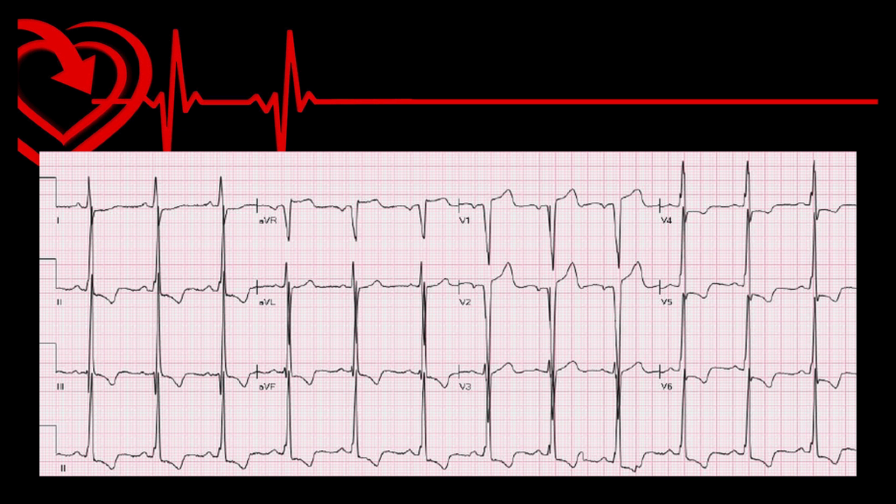This is an example that makes it really easy to spot hypertrophy because the QRSs run into the line above and below. In most of these, you could probably just measure one and get close to that 35 millimeter measurement. The more important thing to focus on is that those deep QRS complexes, even though they're narrow, produce ST elevation and large T waves. At first glance, that can look a lot like the ST elevation associated with an MI, but it's not evidence of an MI, it's evidence of left ventricular hypertrophy and does not meet STEMI criteria.